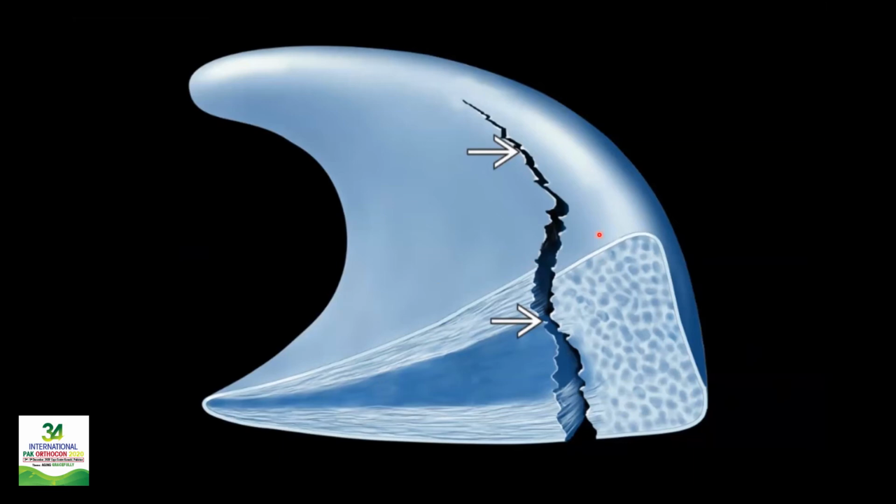Now there are two important things in this tear, the vertical tear. It is normally found in the outer one half of the meniscus. And the second, it maintains a distance from the periphery. If you see in this area, the distance from the periphery is almost the same as we extend along the tear. There are variations where it can go inside as well, but this is the most common pattern of the vertical tear.